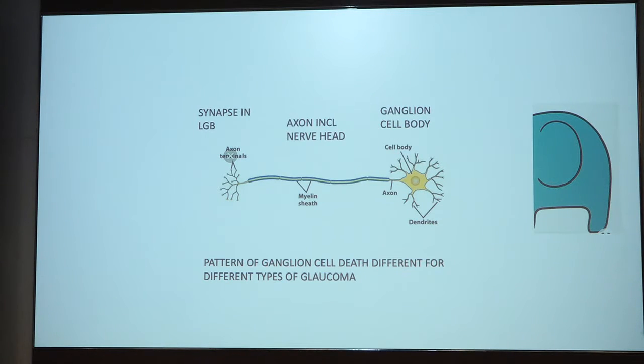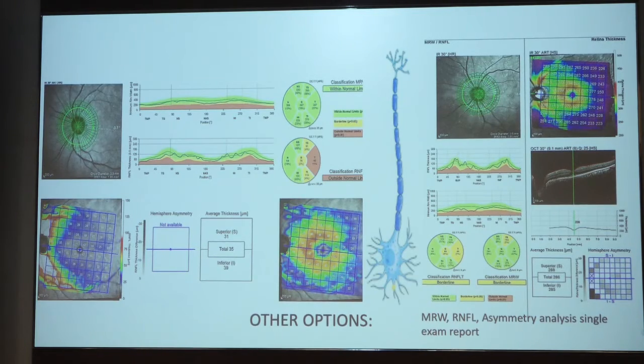So, see from the optic nerve head to the retinal nerve fiber layer to the ganglion cell all at one time. That is very important. So any number of map presentations that are available, make sure all the 3 are in one map if you have to be reasonably sure. Once you do the BMO analysis, the next thing you do is see the entire ganglion in one picture. So here we have the overview printout in the Spectralis, which I'm addicted to, once I'm sure with the BMO MRW printout. So structure correlation it is, and that will get all the 3 structures in one.